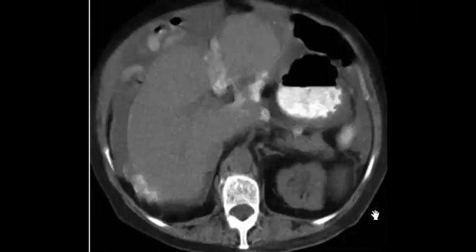And now, what might be the primary? Can you imagine the primary now? Yeah, it can be the ovary, but the ovary has bilateral lesions. So maybe you expect it comes from another primary. One of the most important primaries that gives bilateral Krukenberg tumor is the stomach. Perfect. So the stomach here is the primary. So Krukenberg ovarian tumor, primary gastric cancer is most probably the first differential.